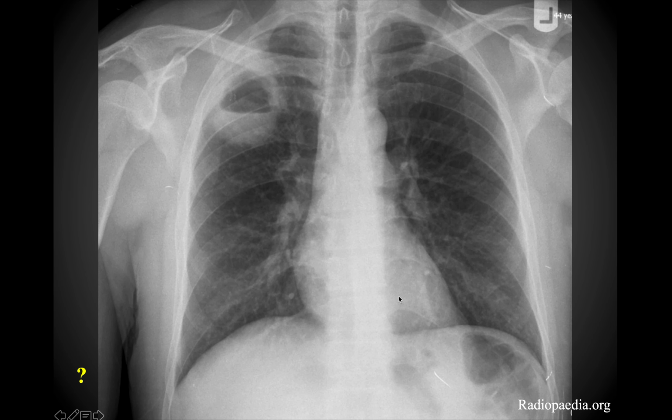All right, and so looking at just another case here, we'll give you a moment to look at it and try to see if you can find any abnormality with it. And once again, this comes down to asymmetry. When you look up top here, you'll notice that we have a nice clear upper lobe of the left lung, but the right upper lobe does not look normal.